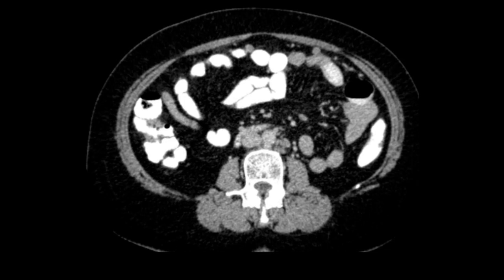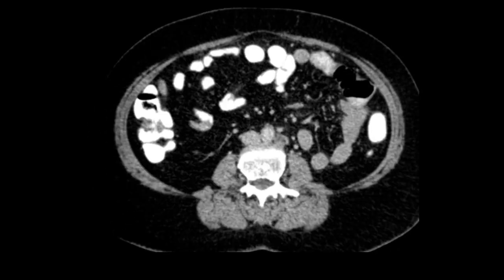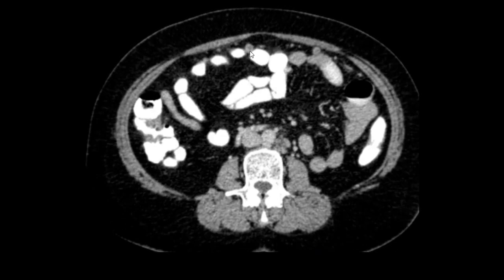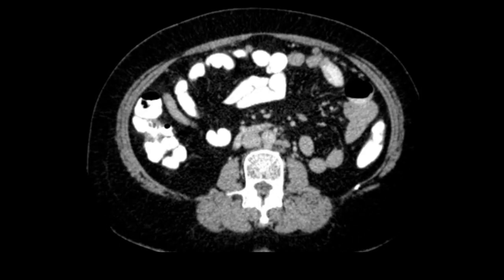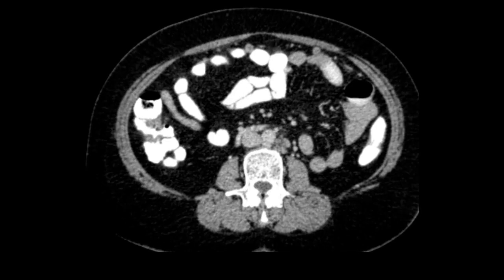This is how the metastasis will look like if it is large, right? But yes, there are these small nodules. These are metastatic lesions. So look at all these points, study the scan along with the clinician who has referred the patient. And for clinicians, study the scan with your radiologist on the console to identify these points, right?